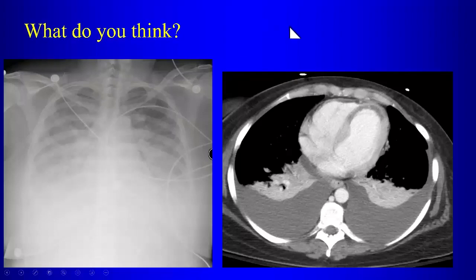So is there another abnormality you see on the CT? The interventricular septum, there's a little bulging into the left. Well, that's okay, that's normal, but when you look at the myocardium of the left ventricle, do you notice anything? There's that little hypoattenuating area. Yes, so here along the endocardium of the left ventricle, towards the apex especially, there's this area that is not enhancing as much as the rest of the ventricle. So what do you think is going on in this patient?